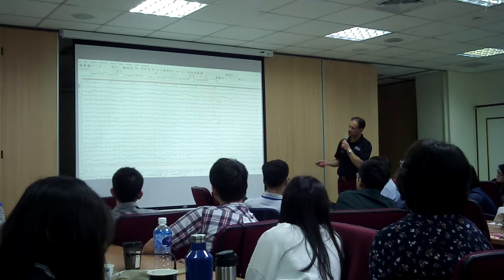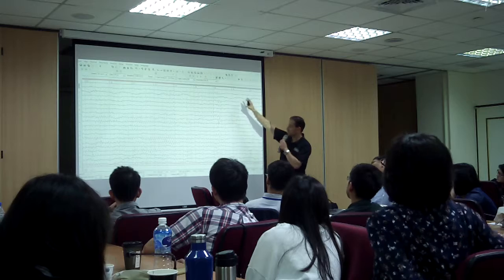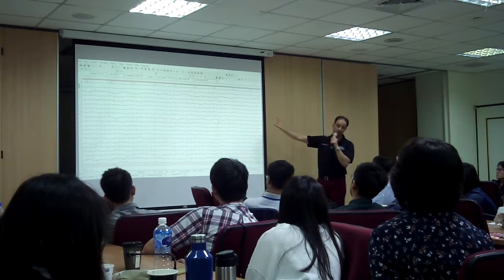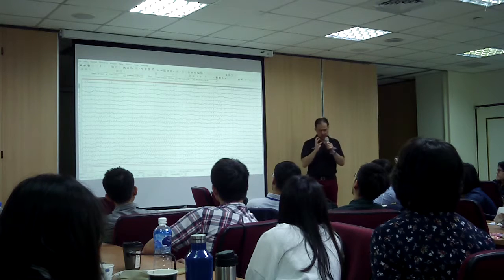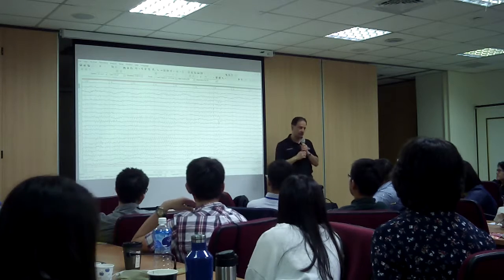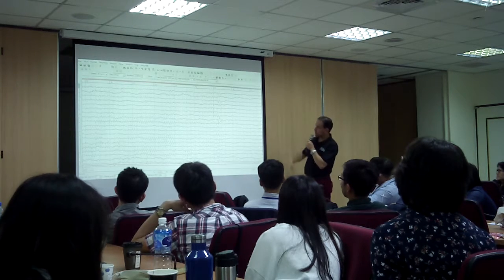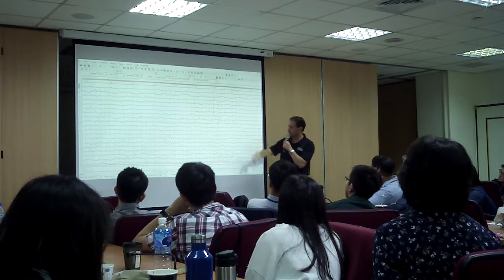Anything else that grabs your attention? So when you look at this, don't look at a specific channel. Look at everything, okay? I want you to train your brain and train your eyes to look at the bigger picture. It's very important. I know you're learning. I know it seems like it is too much, but I want you to practice, okay? You will have time. You have all your lives to get this. So, anything else in this segment that would get your attention? Other than the slow brainwave activity?